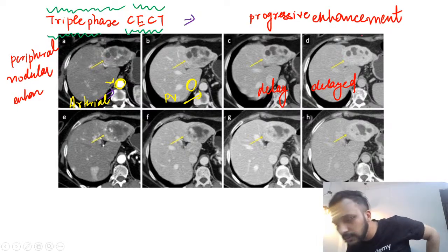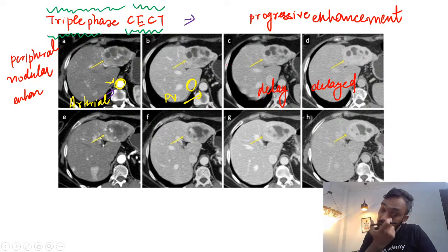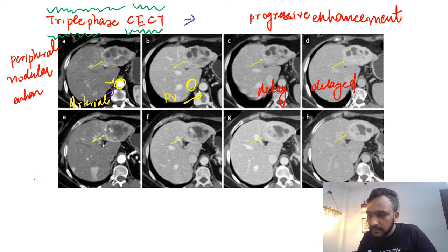Okay, the lesion is showing. Hi Dr. Neha. So the lesion is showing progressive enhancement. So guys, hi Yashashvi Pant.